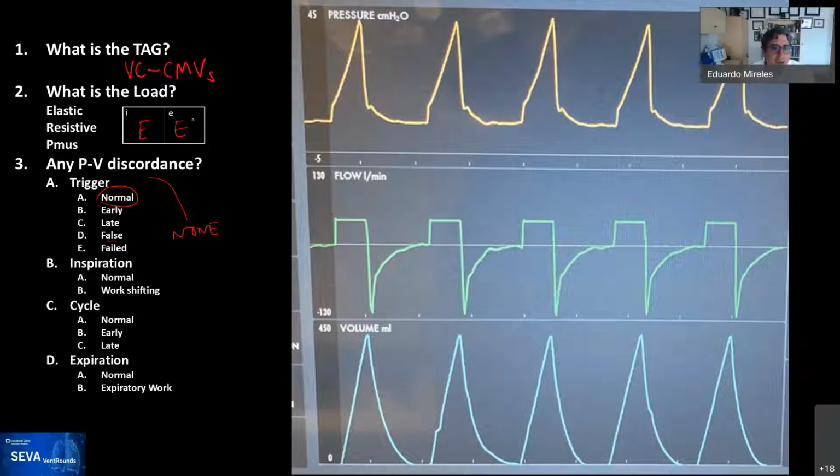In terms of load, you read this appropriately. If you look at the inspiratory phase, the first step up, from this point to this point, all of this rise is all resistive load. It's a straight rise, the flow goes rapidly up, the pressure goes up when it encounters the resistance of the airways, the artificial and natural airways. And then the slope of how this elevates, from this point all the way to the rest.